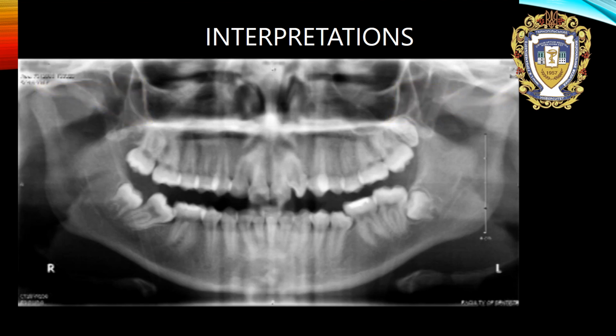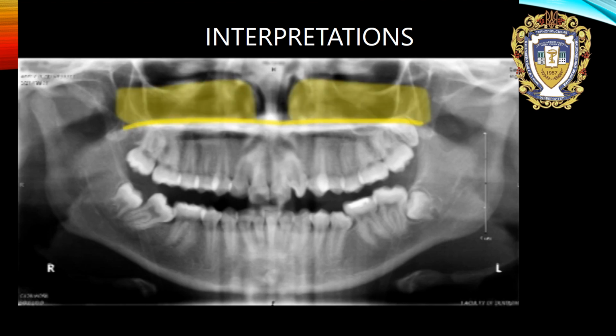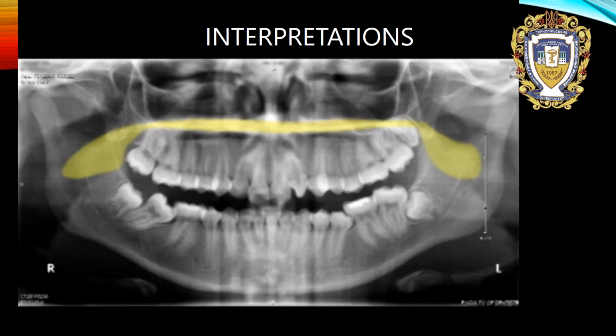Finally, look at the internal density of both sinuses, comparing the left and right sides. Assess the structures of the nasal cavity, including the floor and the concha, which extend horizontally along both sides of the image, and the nasal septum. Note the soft palate, imaged bilaterally as it extends off the posterior aspect of the hard palate.